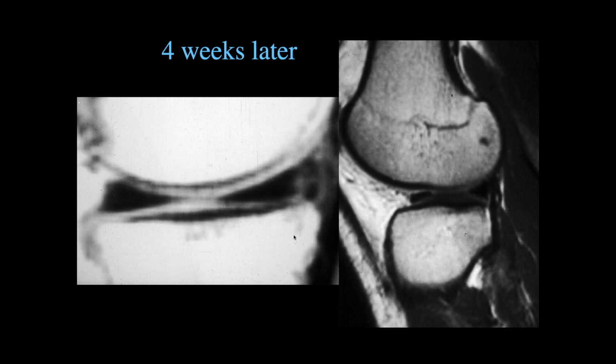Okay, so now I can see the meniscal tear, and it looks like there's. Well, actually, it looks like it's healing, doesn't it? Yeah, I mean, it's less pronounced than the prior, I feel like, but that could just be slice selection. And the bone marrow edema is resolved in the posterior lateral tibial plateau, but the subchondral bone plate does seem a little bit depressed there. So it may be a little bit, but this patient at this point was back playing volleyball again.